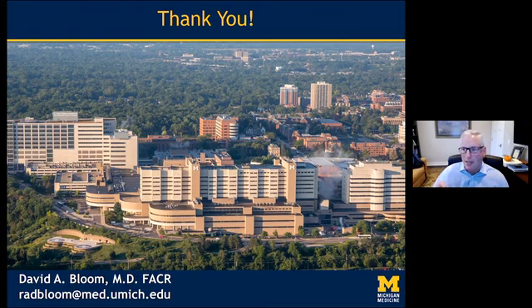And the reason is that it will show you areas of restricted diffusion from subtle tumor seeding that you might not otherwise pick up on your T1 and T2 weighted images as you're doing your routine scrolling and evaluation. And so I see some areas that pop up, and then I can go back and take a look to see if there is any subtle enhancement or nodularity that might be concerning for peritoneal seeding. We had a boy who had an extrarenal Wilms tumor who had a recurrence that was very, very subtle that my partner expertly picked up by using the diffusion weighted imaging first and then going back to be able to find the subtle seeding.